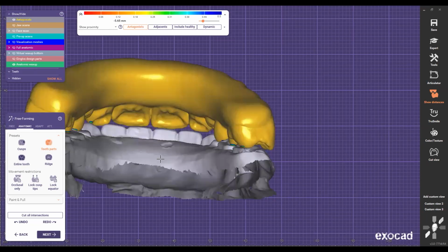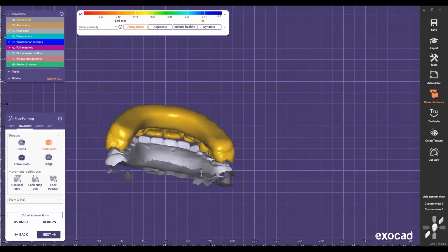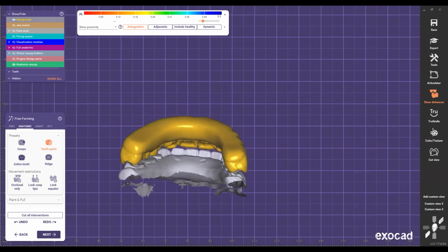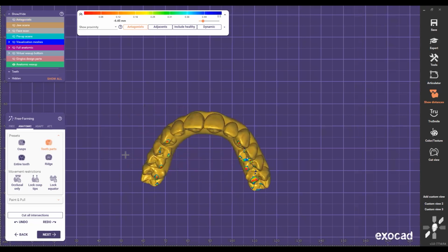Especially when I prefer to do double arches because of these things, right? It's not a big deal to have a single one, but you just need to know where to put the contact on the opposing if it's just a single arch. When it's double arch, no big deal, because everything is in occlusion, following everything, right?